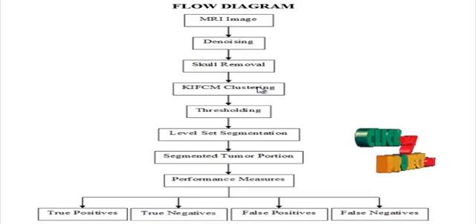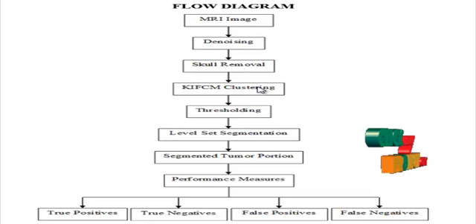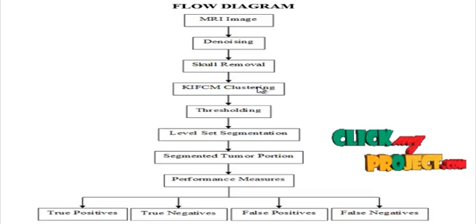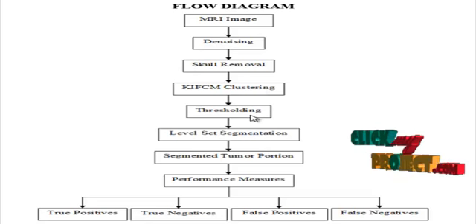Any point in the image has a set of coefficients giving the degree of being in each cluster. In fuzzy c-means, the center of a cluster is the mean of all the points weighted by their degree of belonging to the cluster. Each cluster region represents a region of different intensity. The next step is the thresholding process.